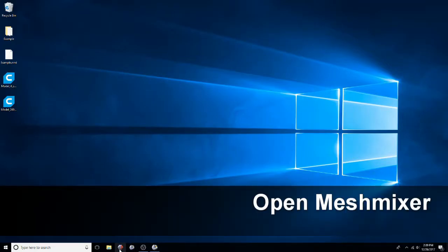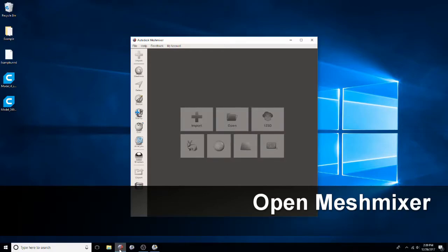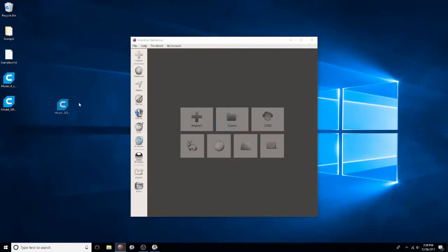It can also be good to save the remainder of those files in Slicer, just so you can go back and edit your labels if you ever need to, but I didn't for this tutorial just because it takes up a little extra room on my computer. So once you drag and drop the model into Meshmixer, you'll let it load for a second.